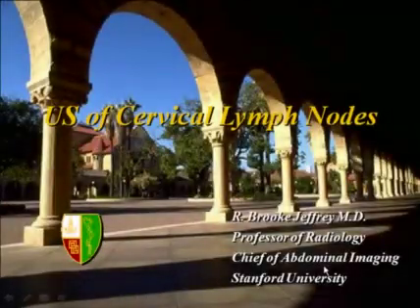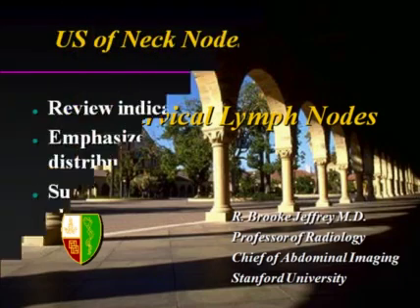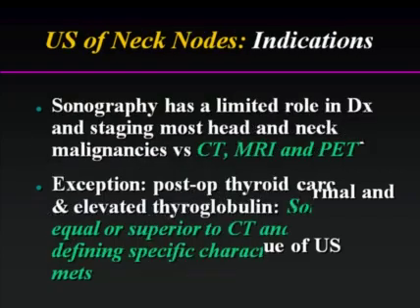This afternoon, my lecture is going to focus on the ultrasound evaluation of cervical lymph nodes. And what I'd like to do along the way is to review the indications and ultrasound technique for evaluating these nodes, to emphasize certain anatomic landmarks for distribution of nodes, and really to focus on the criteria that we'll use for distinguishing normal from abnormal, and discuss the role and technique of ultrasound-guided FNA of these cervical lymph nodes.